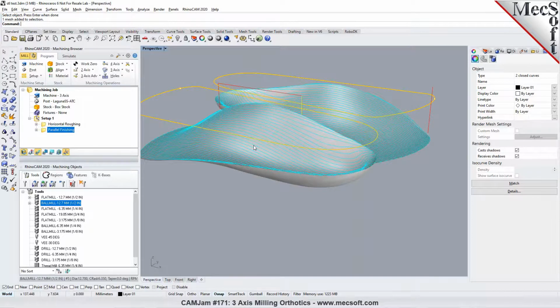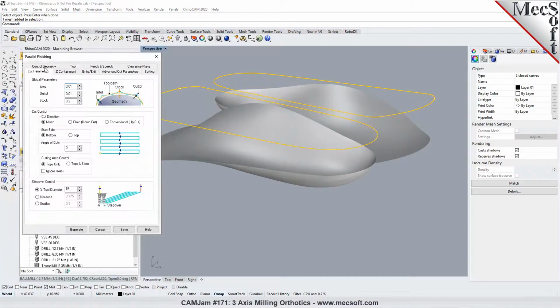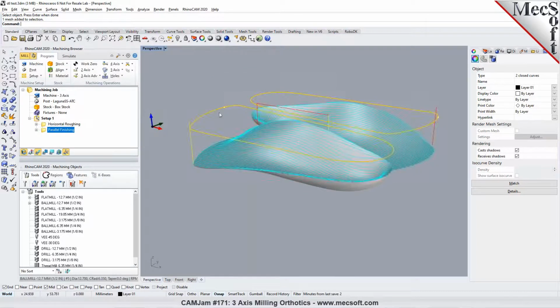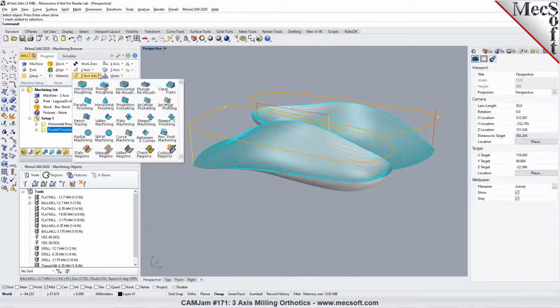Okay, so which is basically at the CAD at the beginning portion of it. Right, you'll have to do it in the, yes, that is correct. So all right. The toolpath is generated for what you already designed, right? Right, what is going to be milled out, yeah.